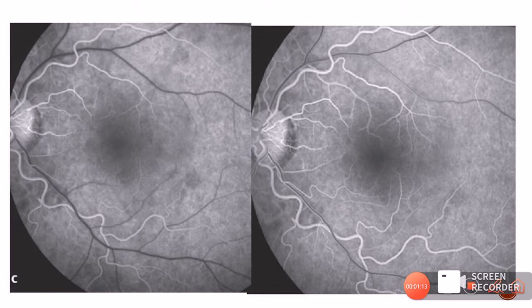In this picture over here, you can see that there is a choroidal fluorescence. That means the choroidal phase is over. The arteries are also filled up with the dye, and the arteries are looking whitish in color. That means the arterial phase is also over. And now let us look at the veins. You can have a look over here. The vein is actually showing early laminar flow. Only this vein, which is very close to the disc, you can see there is laminar flow, and the periphery of the vein is actually completely empty. So this is the early arteriovenous phase.